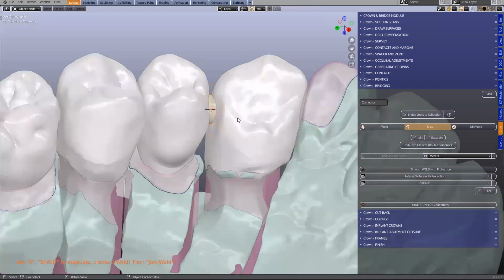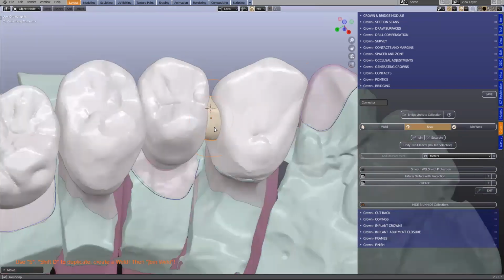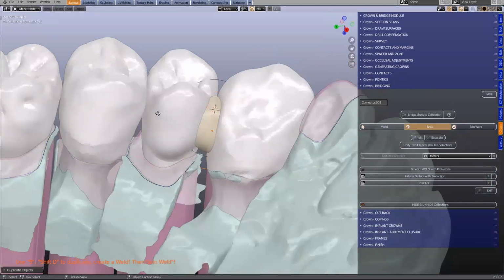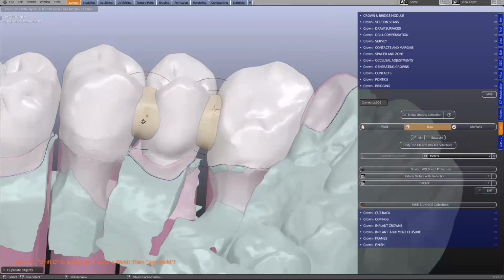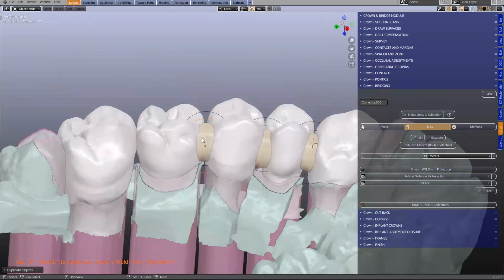So I'm going to put weld. I'm going to use the S key to scale. Now, this is very similar to having wax in a dental laboratory. And those of you who are familiar with that, it looks and it actually feels like, you can see how it drops. It's absolutely fantastic. I love it. So here, what we can do is we can duplicate these, and then we can place this and design our contacts any way we like.